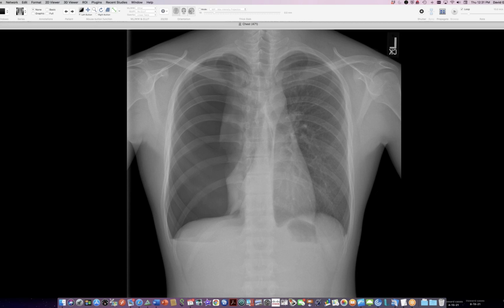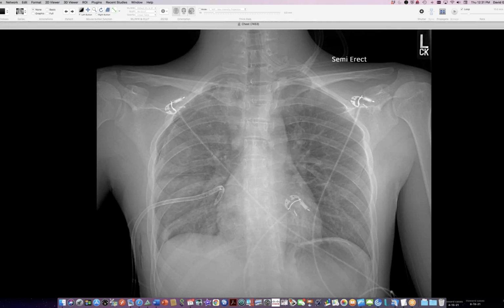So at any rate, they put in a drain, and this is immediately after drain placement. You can see the pneumothorax has been reduced, and there's mild diffuse lung disease. So at this stage, right after re-expansion of the lung, this is probably just microatelectasis. The lung isn't going to be able to expand fully right away. There's been absence of surfactant for a while with the collapse of the lung. And so some microatelectasis could account for this. But that should clear up with time.